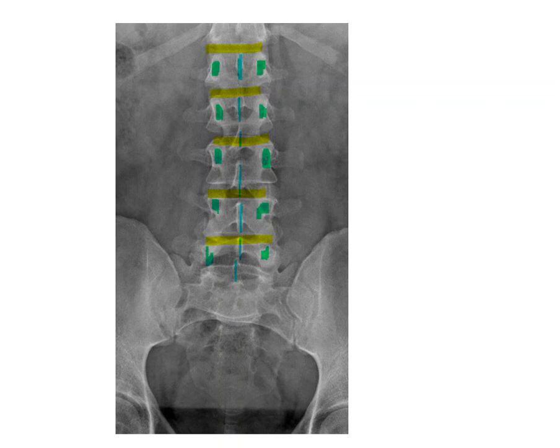So let's look at transverse processes. Transverse processes project laterally from the vertebral body. These are two structures that we look for to project laterally from the vertebral body. And that's going to tell us, once again, if they're equidistant, if they're symmetrical, that means that the patient was not rotated, that we had the patient positioned properly for the x-ray. So it's the transverse processes.